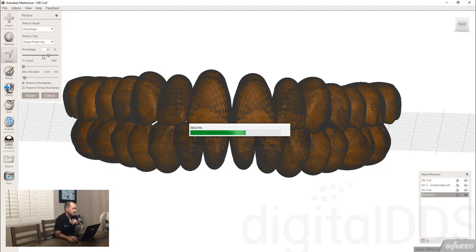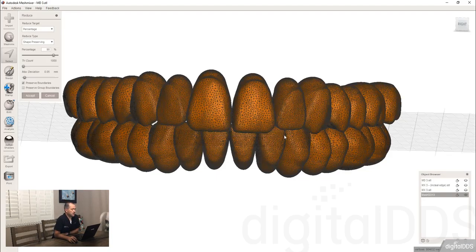And so with these, if I click somewhere and I was like, oh, that's not where I wanted to click, I gotta wait for it to run through the whole process. So sometimes it's easier to just type in a number on the tools that do that. I haven't been counting to see, but I know it's been going for a while, so I'm guessing we're almost there. And then we'll see.